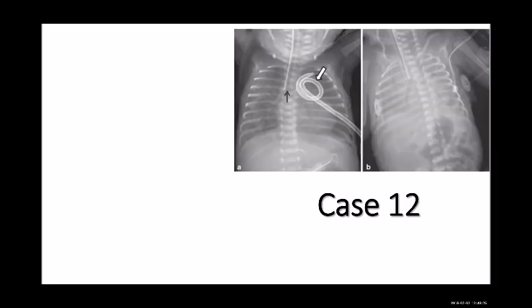In a neonate, you will never have PA view. It's only in adults, because you have to get your shoulder like this and grab the X-ray film, and the X-ray will hit you from the back. So it's always AP view, because the film will be on the back. You're right, there is no very well oriented X-ray. What else?